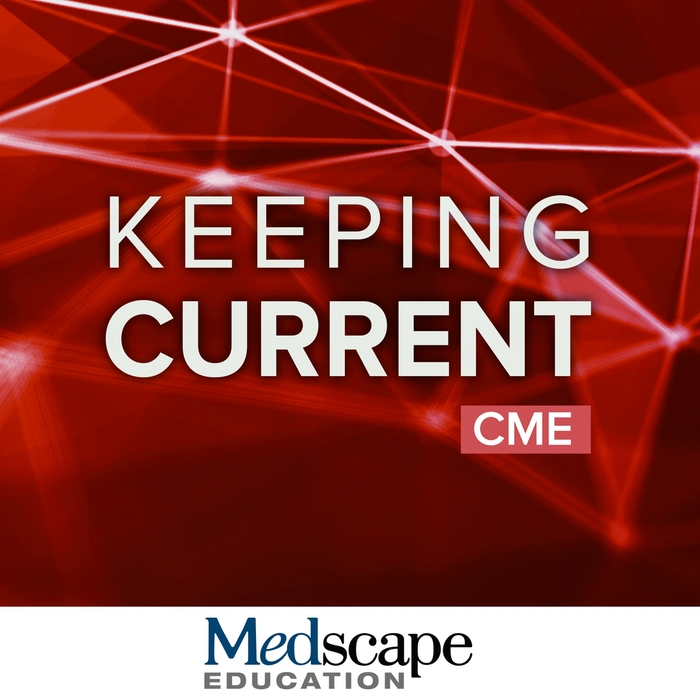So when we're evaluating ischemic heart disease, we typically focus on these three basic techniques. Now, coronary MR angiography was very popular as a technique for evaluating ischemic heart disease, but has essentially been superseded by CTA. So I'm not going to focus on that as much. The other two techniques, stress perfusion imaging to look for any ischemia in the heart, is a very useful technique, as well as delayed enhanced imaging, which we're going to focus on in this lecture.